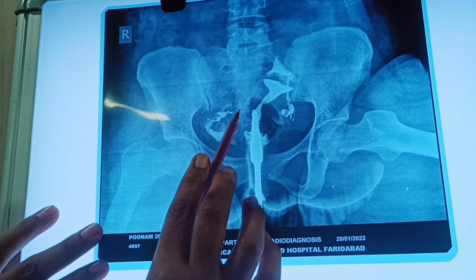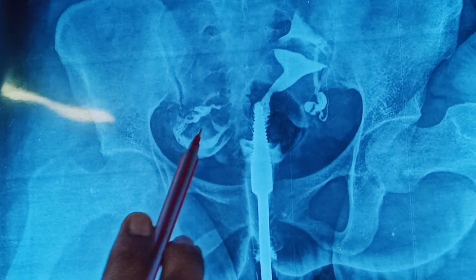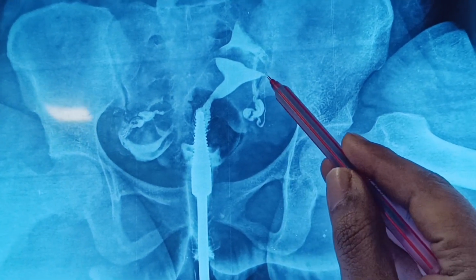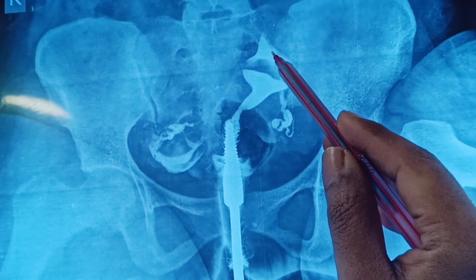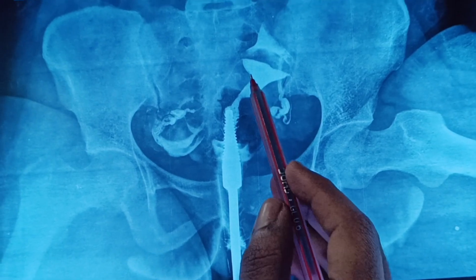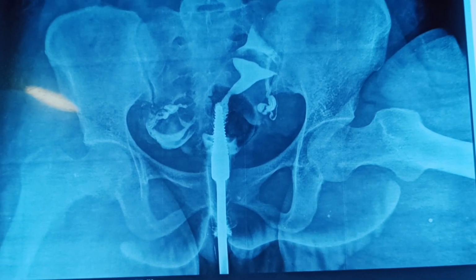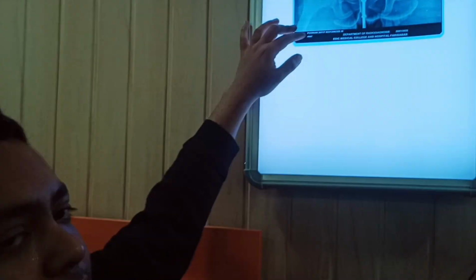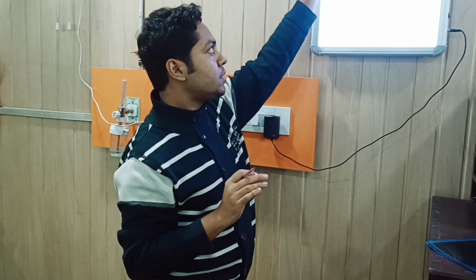You can see this is the right tube and this is the right side free spill, and this is the left tube. Can you recognize this is the left tube and it has gone there, and this is the right sided spill. So this HSG shows the film of a normal patient with bilateral tubes patent. This patient is a case of infertility. Generally in evaluation of infertility we get HSG done. This HSG shows whether bilateral tubes are patent or not.